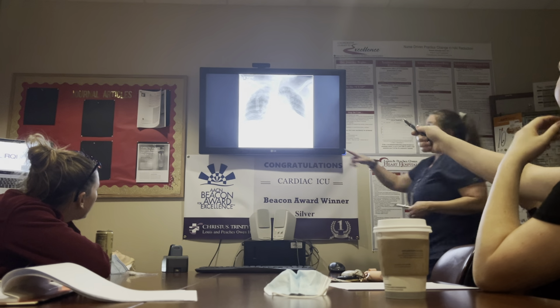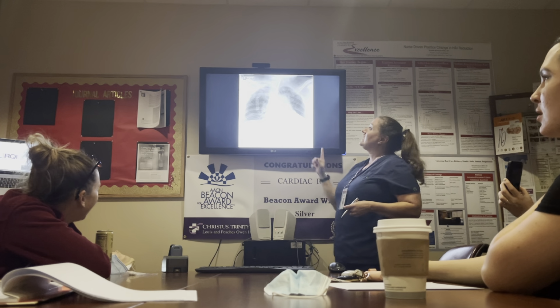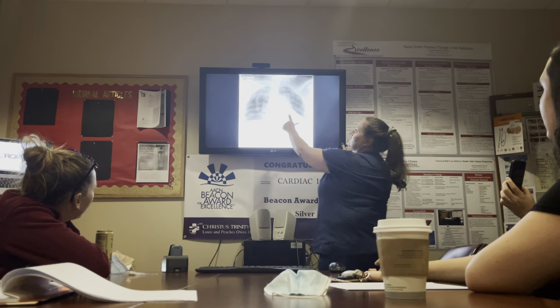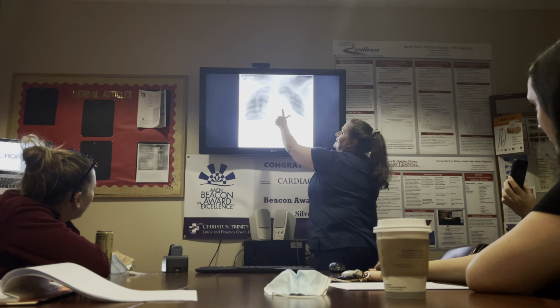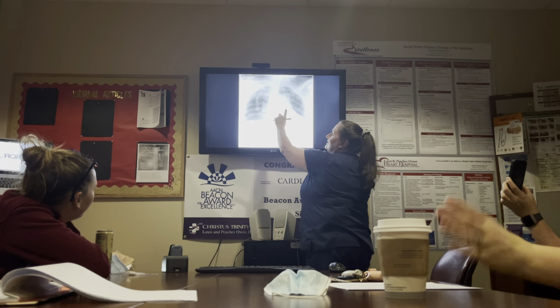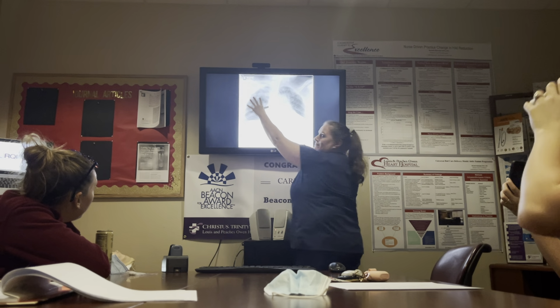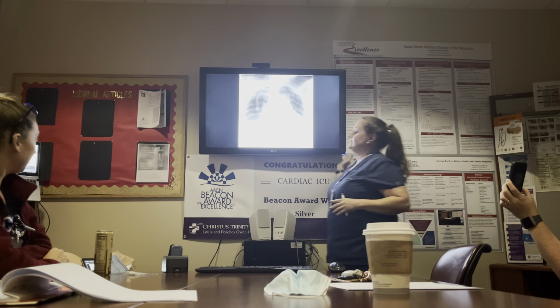What is that on the right? Is that a piece of tape? That's tape. Okay, so what did they have done? You can kind of sort of see the shadow here. This is an ECMO device. They've also got the Impella in there, but this is the ECMO device, and this is the tubes taped to the chest. Okay? All right.